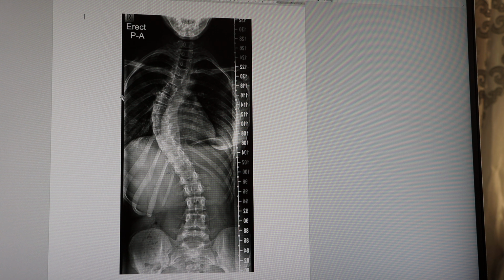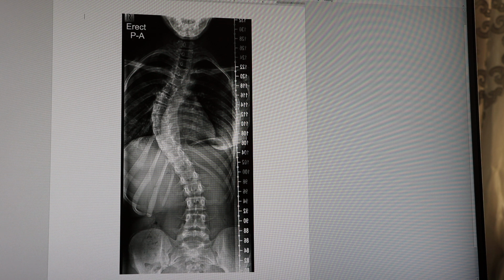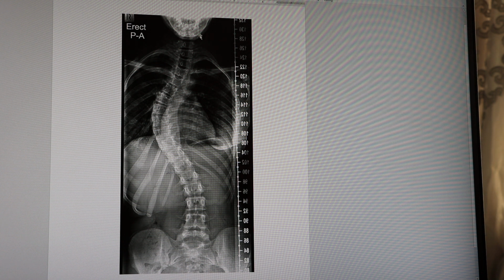Now, when you view the X-ray image, you'll be looking if you can find any apparent congenital anomaly in the X-ray image. If yes, then you'll go for the CT scan. It's most accepted now to go for a CT scan to identify the exact congenital anomaly.